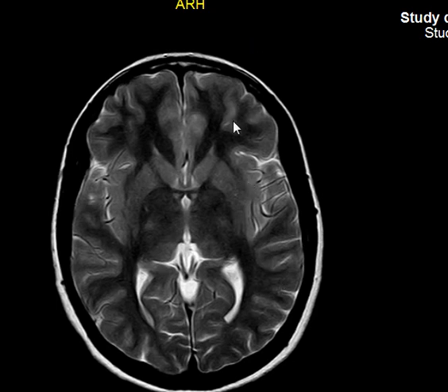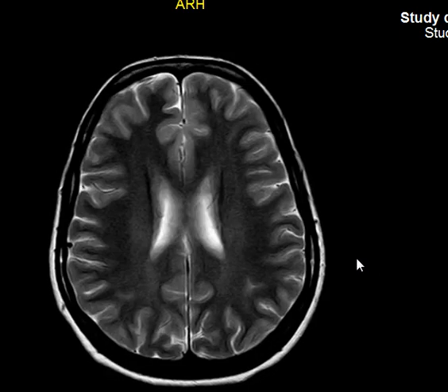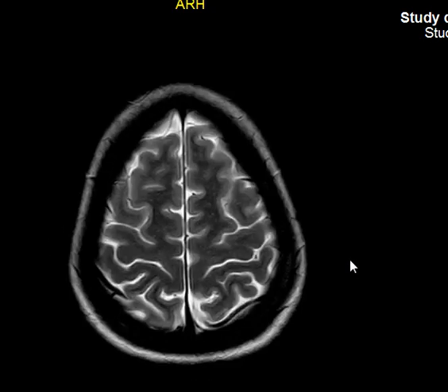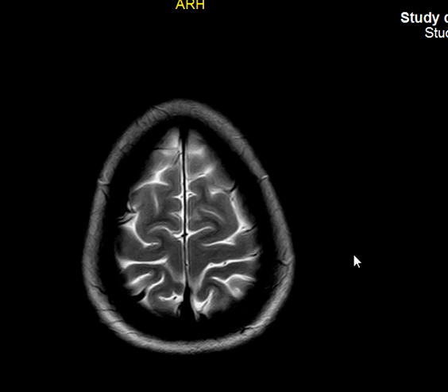So, first of all, you need to separate the frontal lobe from the parietal lobe. Okay? How do we know where is the frontal and where is the parietal? You need to look for a sulcus that's called the central sulcus. Central sulcus, we agree the sulcus is the groove. You look for the groove that separates the frontal from the parietal. How do you know where is the central sulcus? It's easy. The only one that reaches the midline.